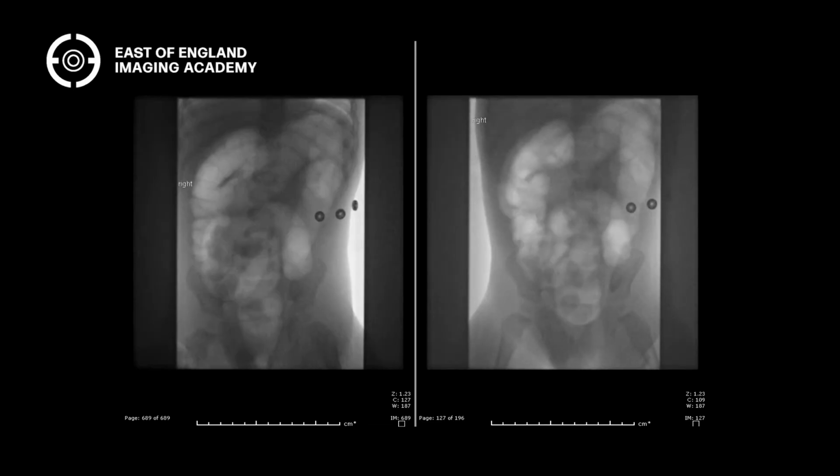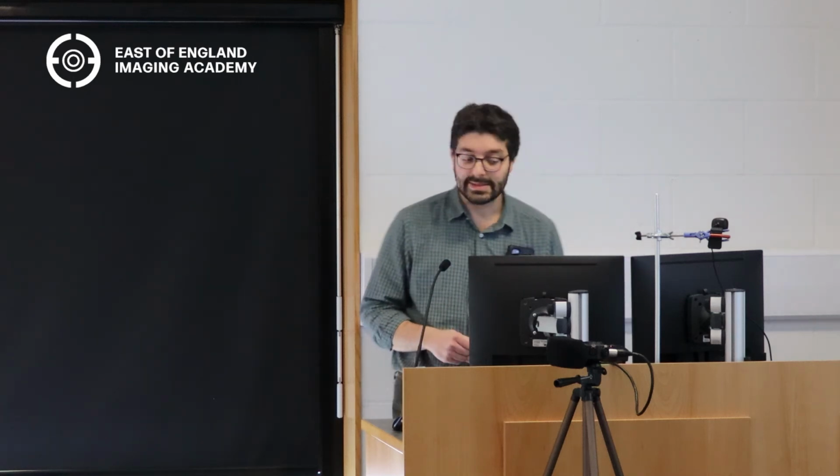So, and then you can see some more gas sort of filling small bowel loops and things like that. So, yeah, it's not all about CT. It's also about other things as well. And as radiologists, we do quite a lot of treatment as well. Interventional radiologists to a certain extent, the pediatric stuff as well, the intussusception reduction. It's very, very satisfying.